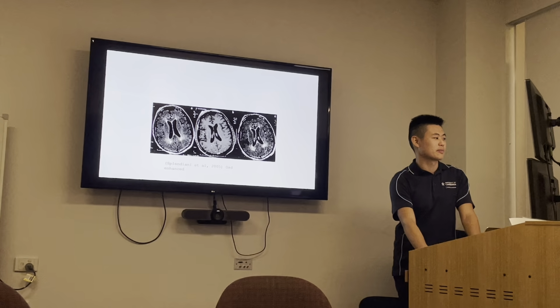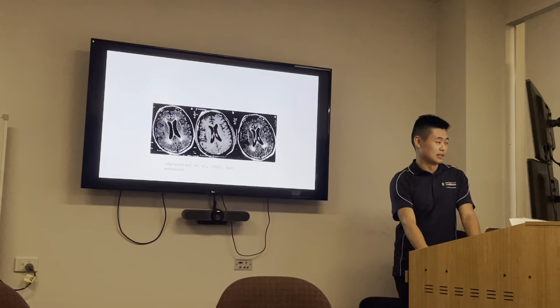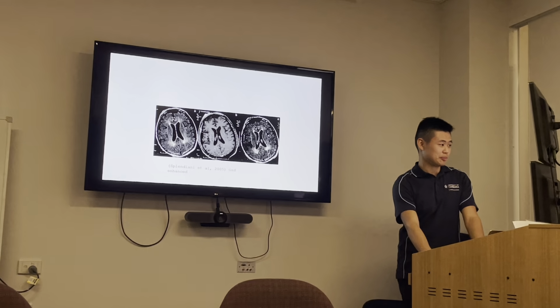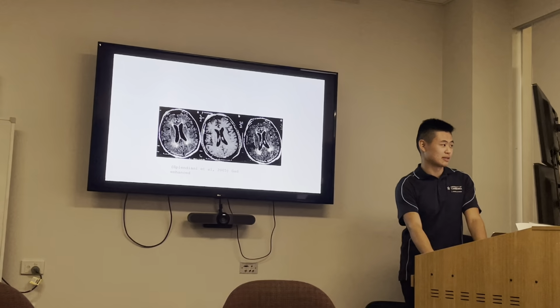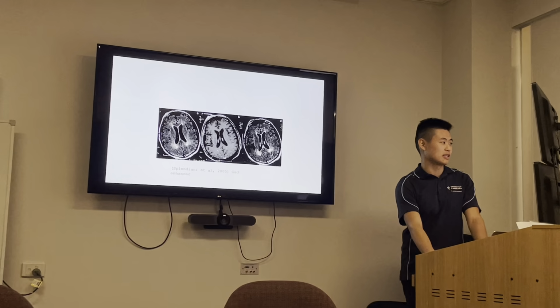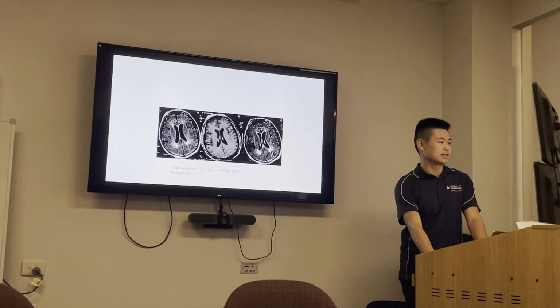So this is actually not from the patient, this is just a FLAIR of a different one. So the CSF is suppressed over here, and you can look at the adjacent tissues for any brightness.